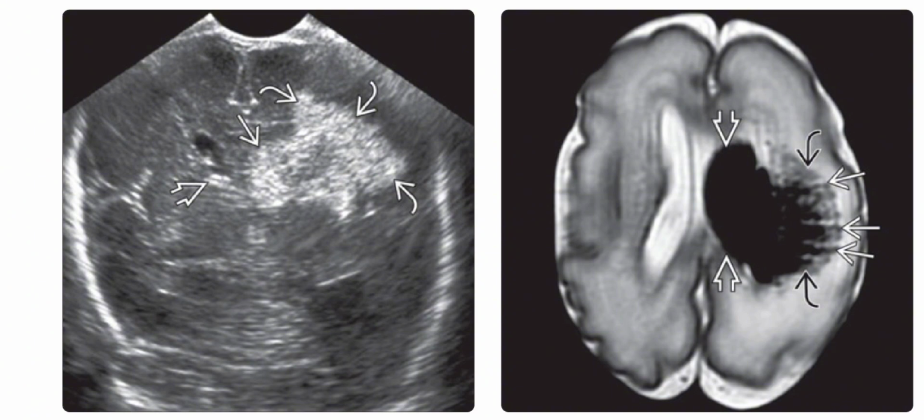Right image is the axial T2 weighted MRI in the same infant, and it shows the hypointense hemorrhage in the ventricle and the associated PHI. Note the radiating pattern of the medullary venous thrombosis in the PHI.